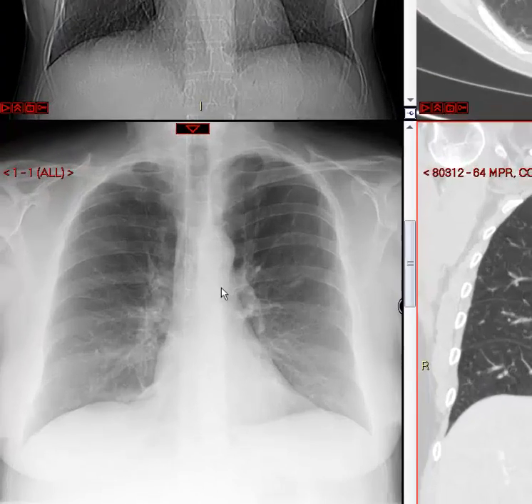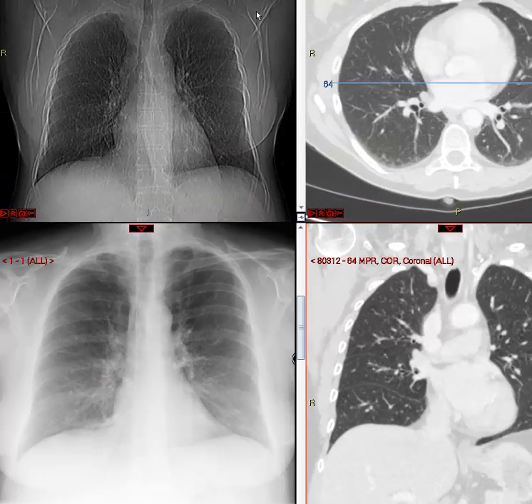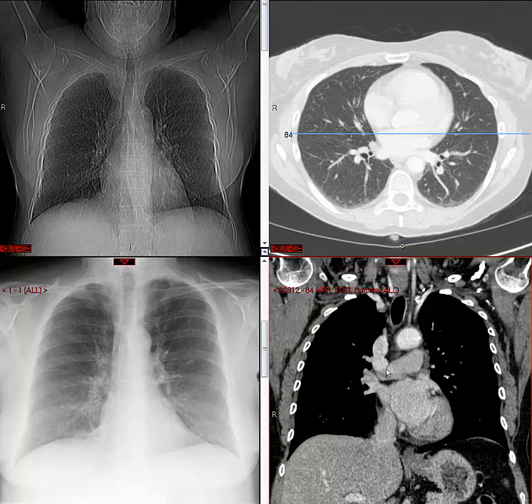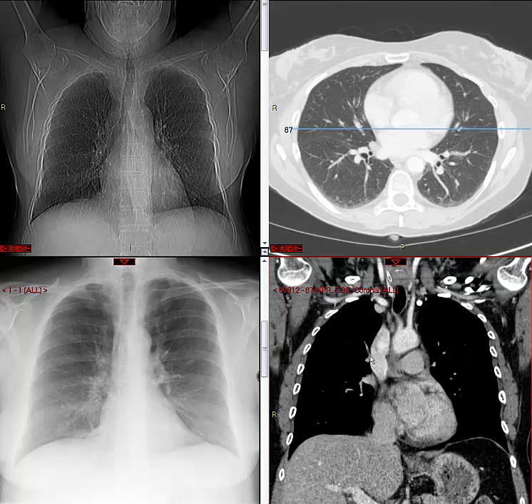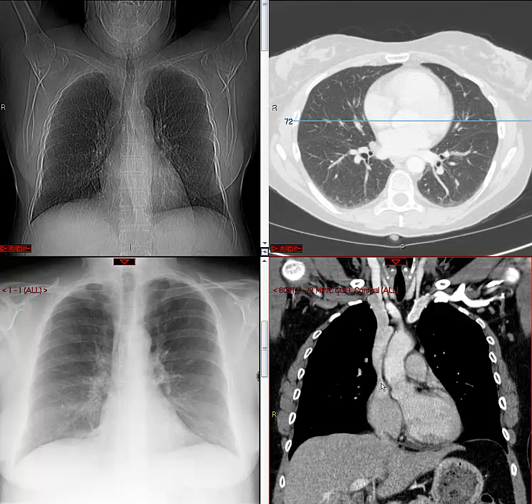Next, let's consider mediastinal shadows, and we'll start with the right border, beginning with superior vena cava, which makes up this shadow, until we get to this angle, at which point it will become right atrium. Let's change our windowing to look to the CT to see why. So if you look at the superior vena cava here, you see it makes up this shadow until it empties into the right atrium, which is right here, which makes up this border.